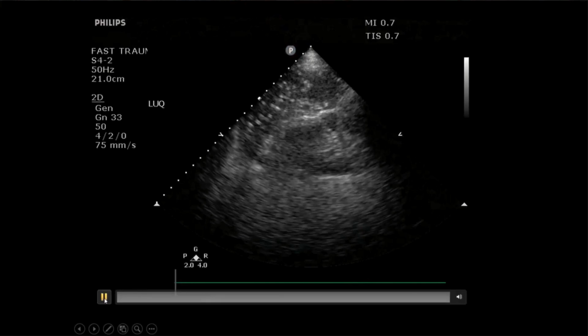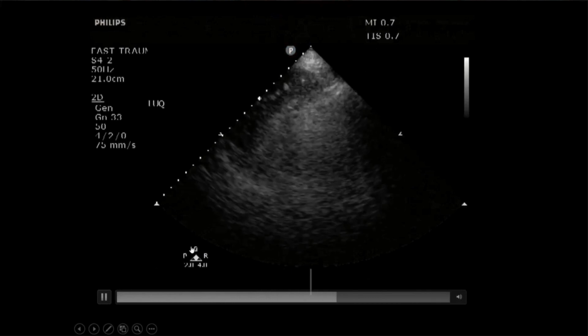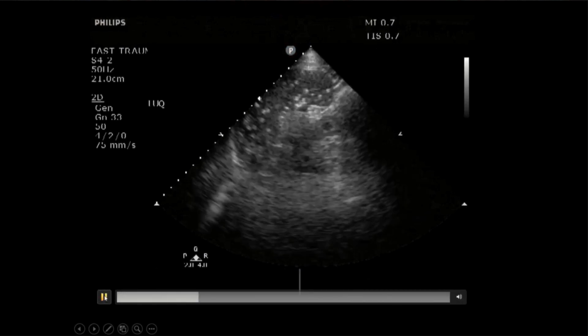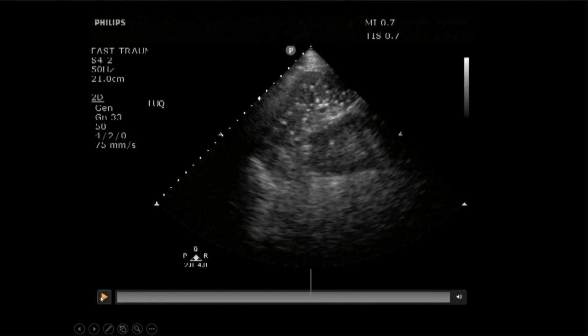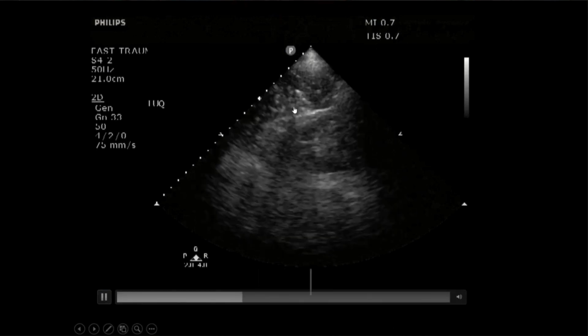How about these little guys? Spleen. They came from the southwest, what might you think they had? And I'll tell you, this is not air. So these are nice. They're kind of round, really hyperechoic.